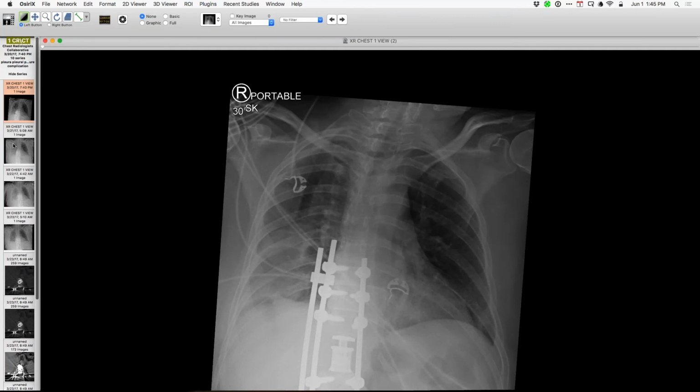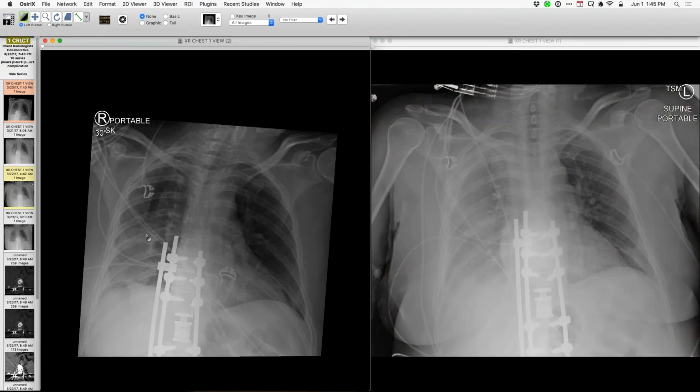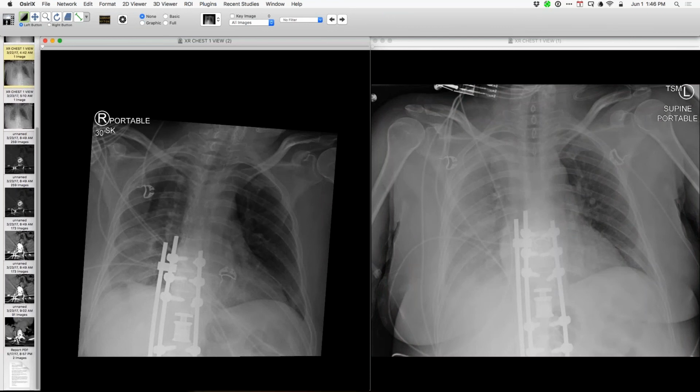Okay. Here's a patient that had spinal surgery, and here are some first radiographs over time. Here on the 20th of March, it looks like that. This is the 22nd of March, and you can see that the dominant finding is accumulation of right pleural fluid. That is a big finding on the radiograph. They were concerned, and they presumably tapped some of the fluid, and then became concerned about a communication between the thecal sac, the spine, and the pleural space, as in a leak.